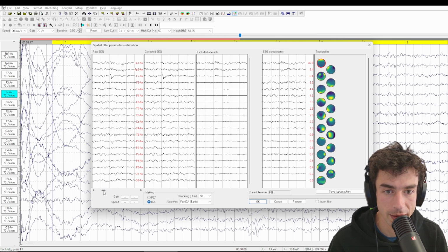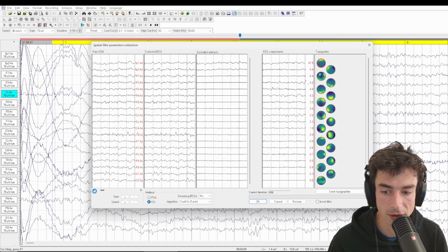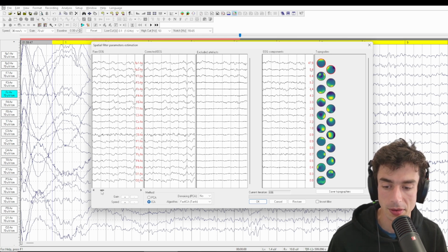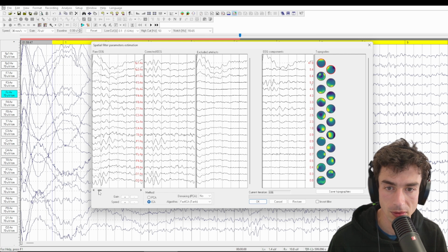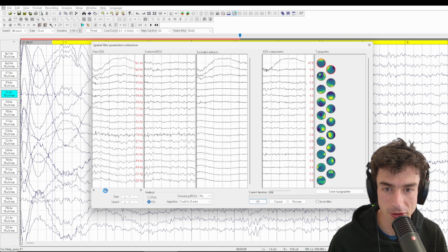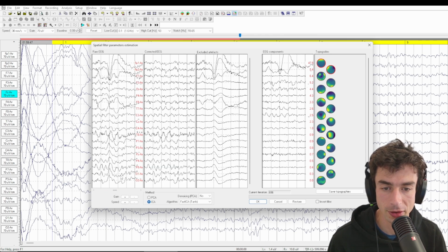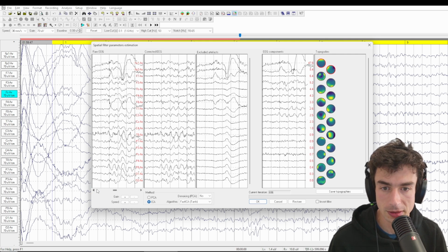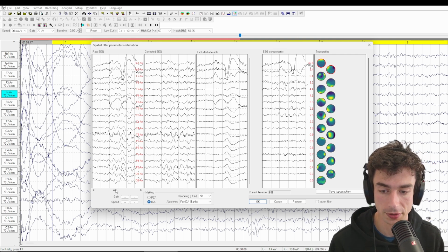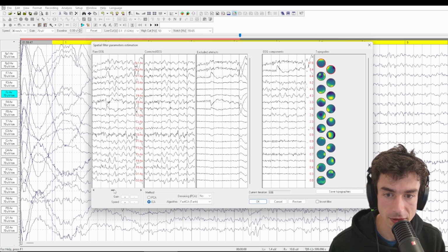And I'm actually going to scroll back to that same fragment if I can, because that's also a good area to assess how good the lateral eye movement component is. Yeah, we might not be able to find that particular one. So we notice a lot more lateral eye movement later on in the record, and we can see that this component is doing a pretty good job of pulling that out and not squashing the rest of the EEG in the lateral frontal sites, F7 and F8.